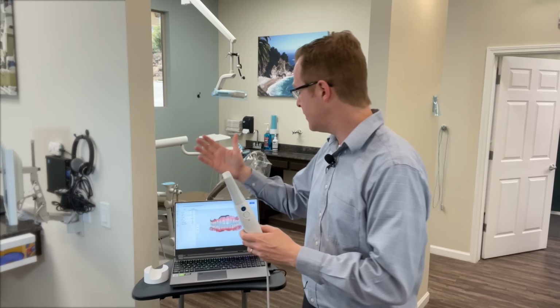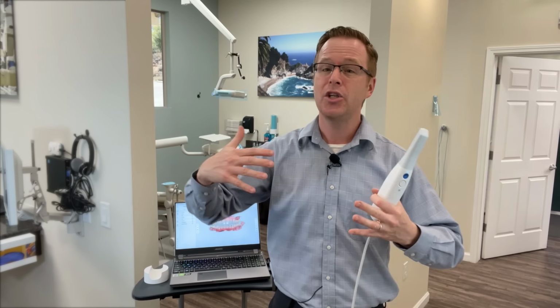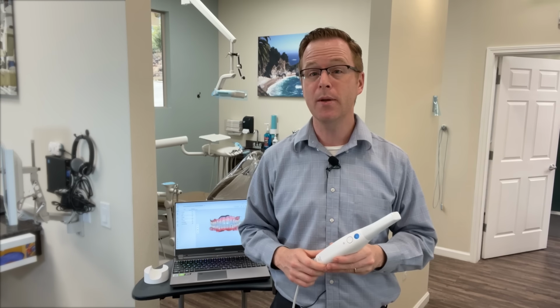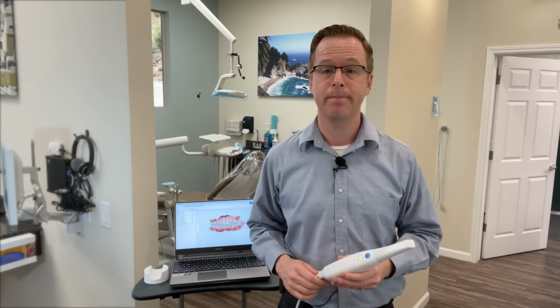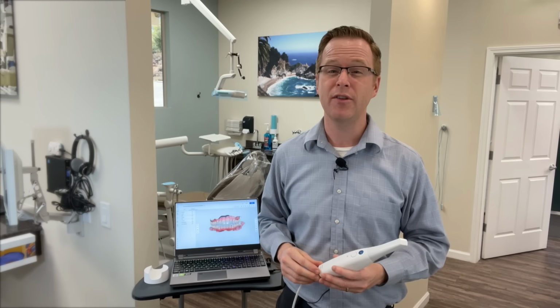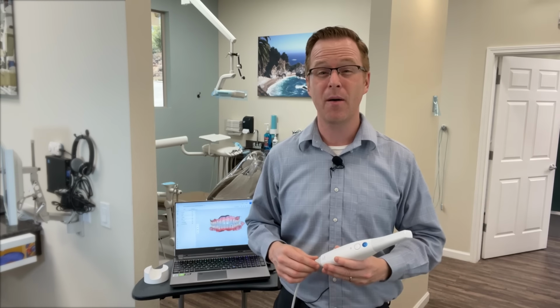And those dental models, in a historical case, we'd have to go ahead and use an intraoral scanner, save it from the Medit Link software, export it to another program, open it in another program like 3Shape, exocad or Meshmixer to be able to go ahead and build the model from our intraoral scan. When we're thinking about that as a clinical workflow, for me as a clinician, that means multiple extra steps that we have to go ahead and utilize just to be able to print a 3D printed model on our patient.